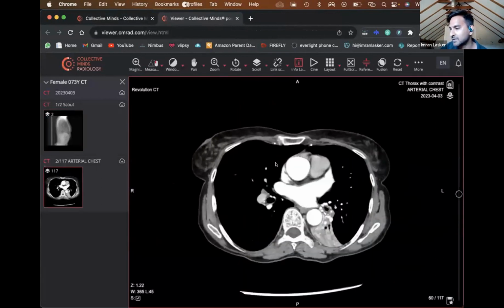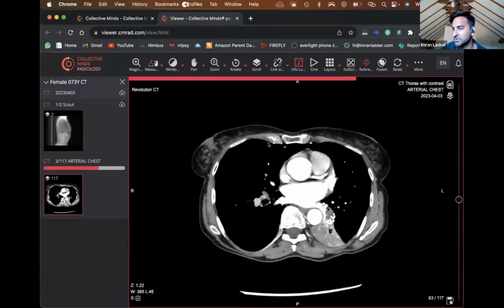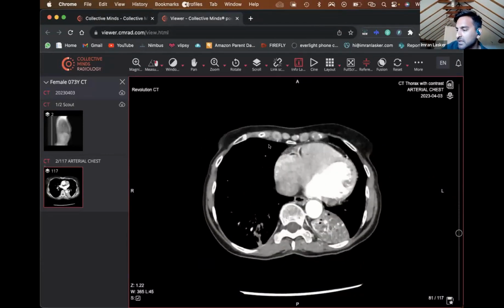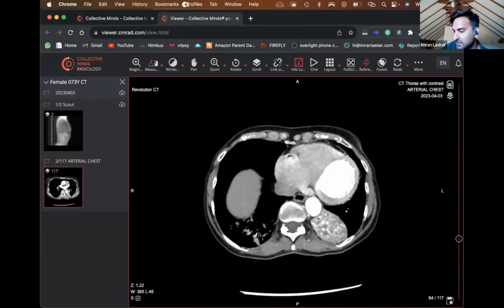Okay, and I think this is not quite the same case, because in that case we had a right upper lobe collapse, but this is just an illustration of what a collapse can look like. Do you remember we were looking at consolidation? That was where you got air bronchograms, located within the airways, giving you that linear radiolucency.